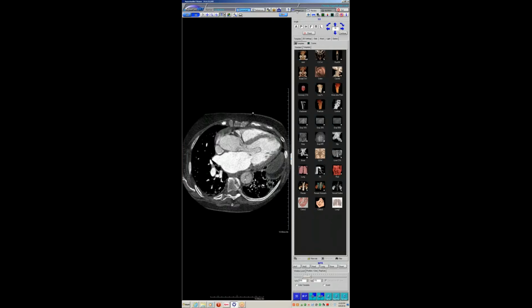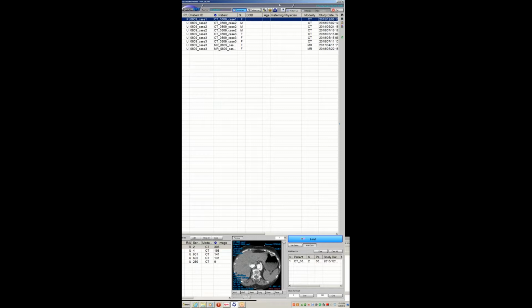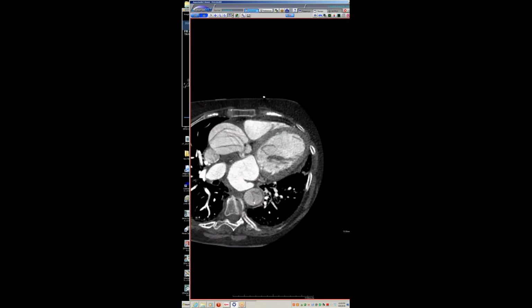Yeah, yeah. Can you scroll through? That's lovely. Can you scroll through? Are you finished with that? Because I'd like you to scroll through. I was just going fast. What do you want me to do? Just scroll through the ascending aorta.